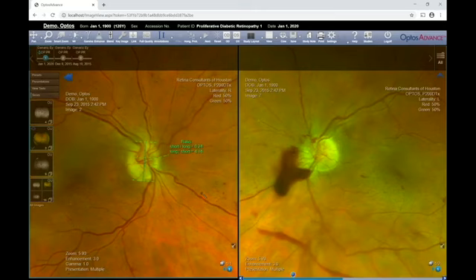To remove an annotation from the image, right-click on the annotation and delete.